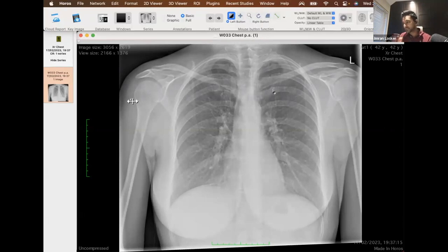We've got an adult patient, and we can see nothing grossly abnormal in the beginning. So I've always got these check areas. For those that don't know, they're going to be the lung apices. I always look at the costophrenic angles as well. And then I'll also have a look at the heart, just to make sure there's nothing behind the heart. There's nothing behind the heart from what I can see. If anyone can see anything, do let me know.